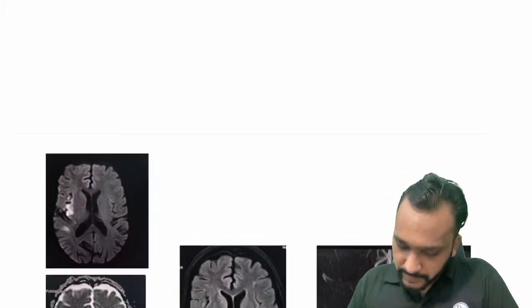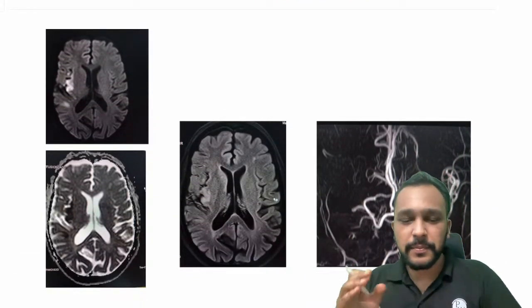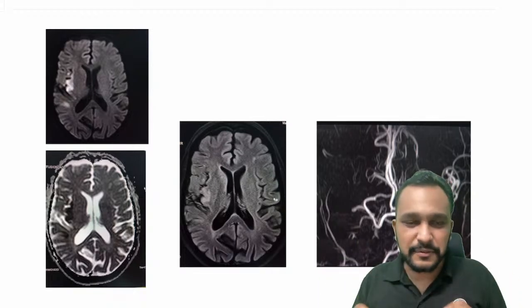Nothing but it is focal or global neurological deficit, right? So let us have a look at these images, and the purpose of this lecture will be that by the end of this lecture we are going to understand these images, right?